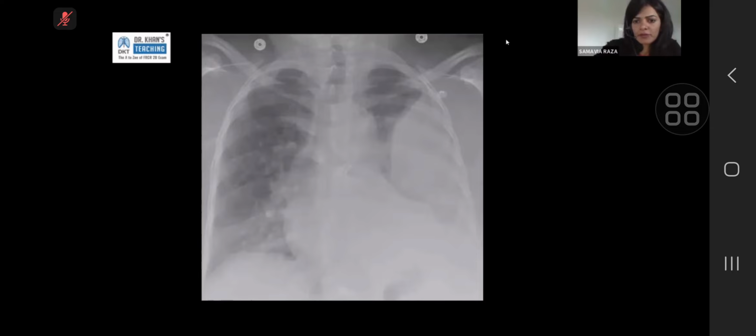Okay, I think most of you have called it right. This is indeed infection, and the reason it is infection is what I said before, that the empyema or infective pleural collection almost acts like a mass, because sometimes because of the thick contents or because it is inflaming both the visceral and the parietal pleura, so it's actually just stuck in that place and it expands in that place rather than go up and down.